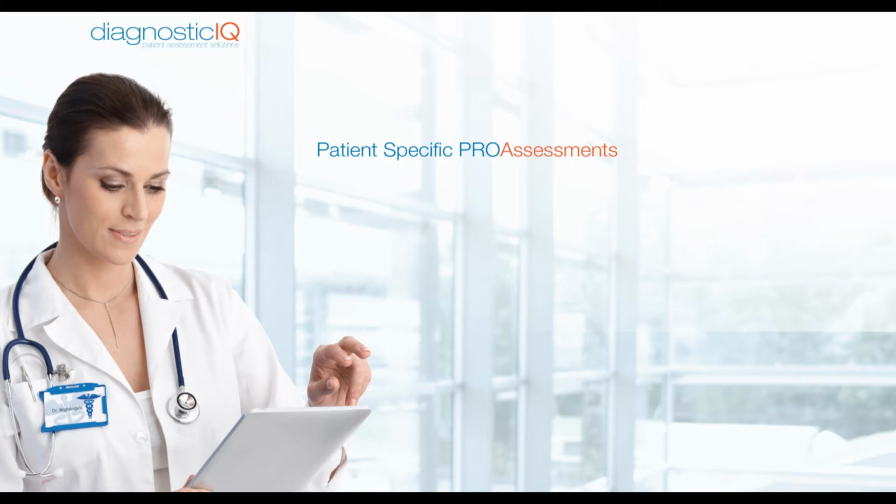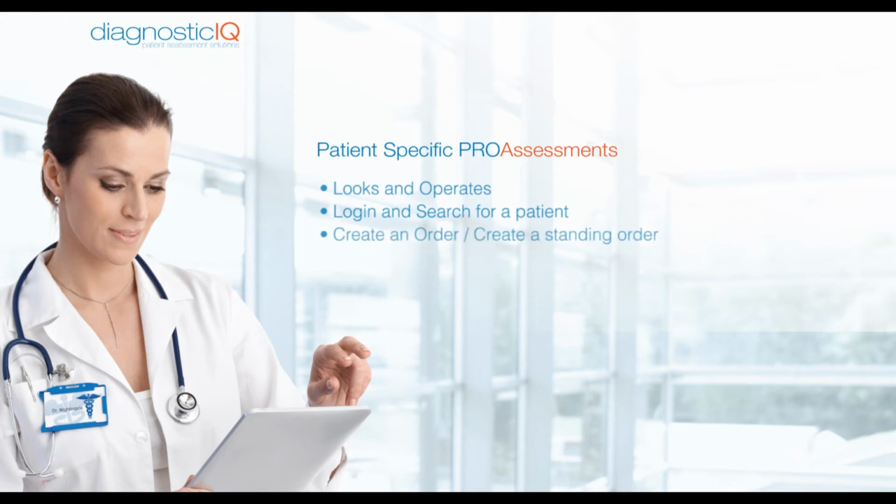In this video, I'll show you how your dashboard looks and operates. We will discuss how to log in, search for a patient, create an order, create a standing order, and lastly, view a patient's results. So let's get started.